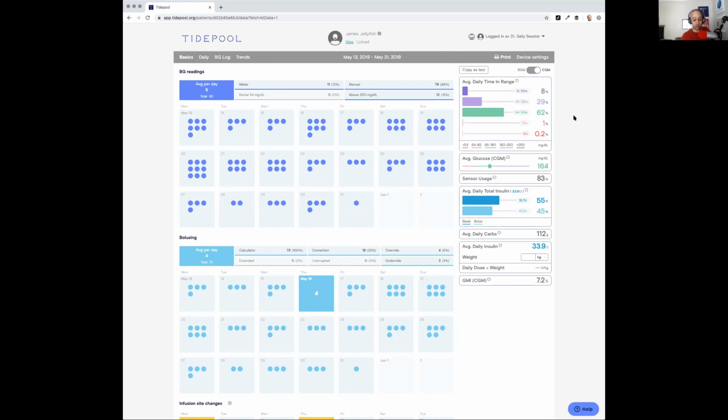And you can see that because you've got the big green bar right here, and you can hover over each of these different sections to see the blood glucose range. Here for time above range, it's 180 to 250, and how much time you're spending on average per day based off of CGM data in terms of your blood glucose targets. How do I know that's CGM data? Because there's a toggle right up here that is right now selected to CGM. If you're only uploading blood glucose meter data to your Tidepool account, you can actually toggle this to BGM, and all of our summary stats around blood glucose values would be based off of your meter data instead.